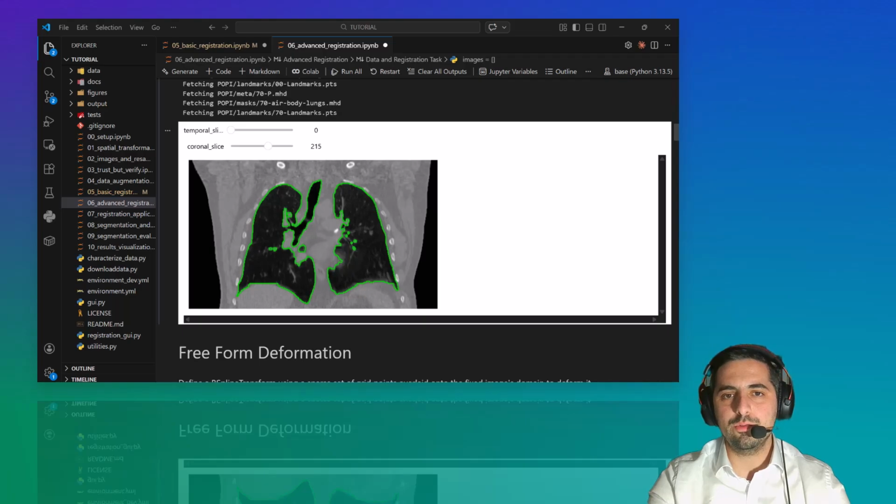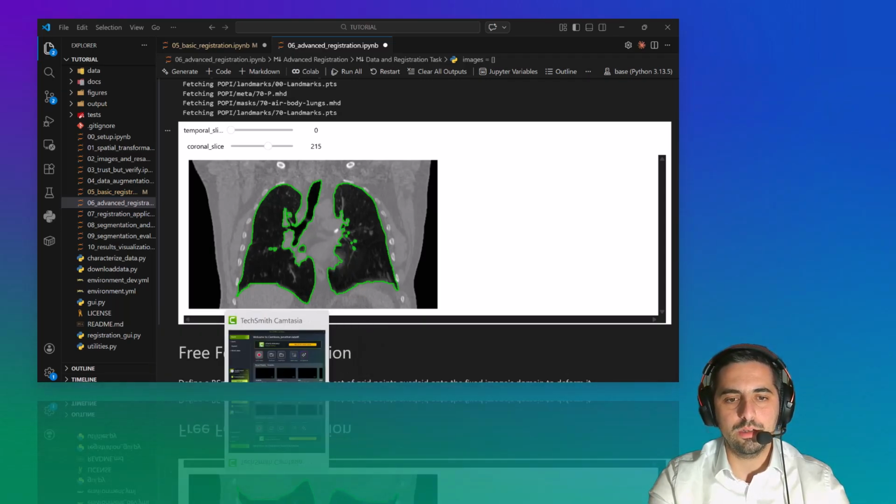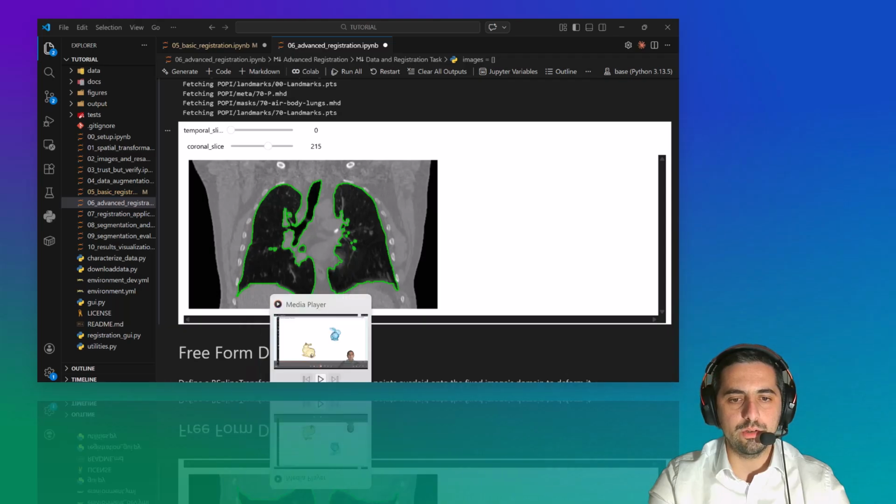So let's first of all go back a step just to understand what a registration is, what a non-rigid registration is, and also what the difference is between the point cloud and the CT image. Let's clarify it, and then go ahead with the code.